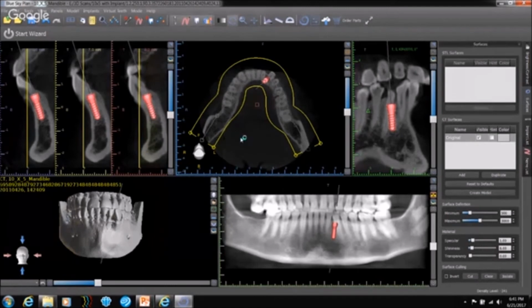Now, it is also imperative to note that the anterior mandible is another area where you see a little bit more thinning of the bone. I've mentioned this, I just want to reemphasize the fact that there is more thinning of the bone than the posterior area. So to assess the anterior area, it is conventional wisdom that you do need three-dimensional imaging to do any kind of radiographic planning or virtual planning for the sake of doing radiographic guides or guided surgery.